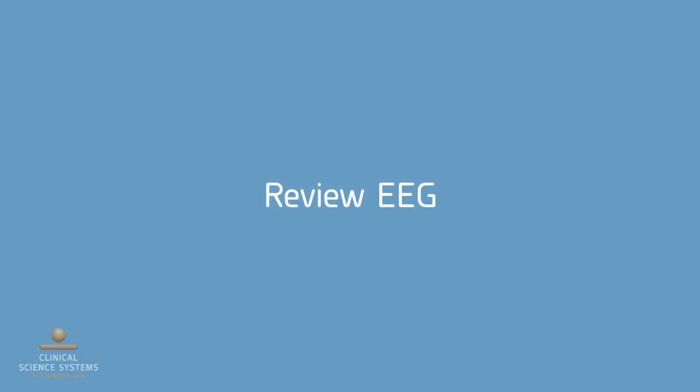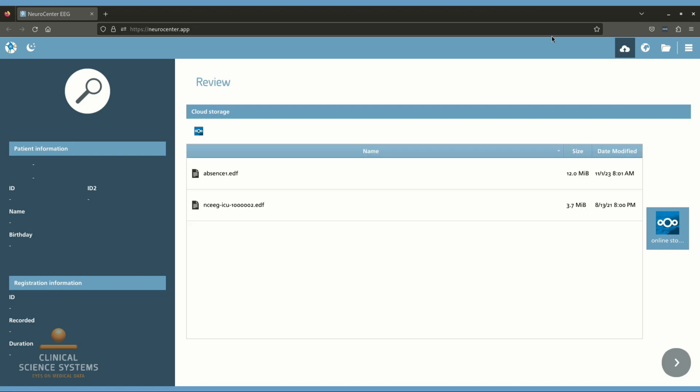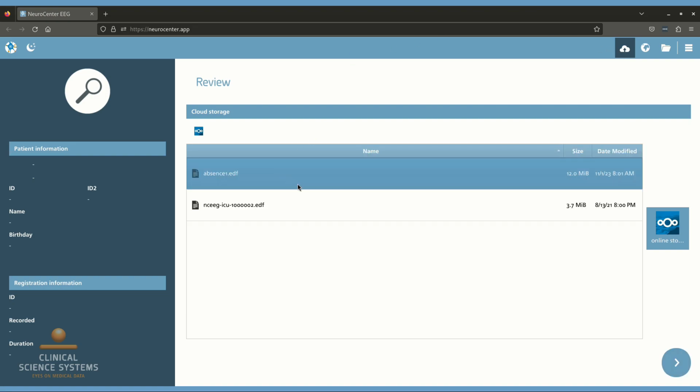Let's review the uploaded EEG. We click the cloud icon to select the cloud storage and select the file we've just uploaded for review. The file is being prepared and shown.